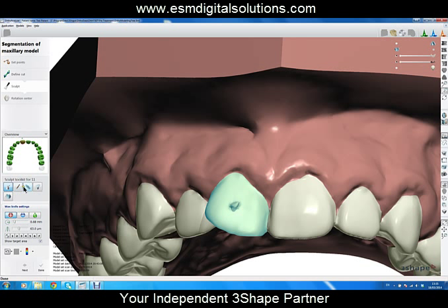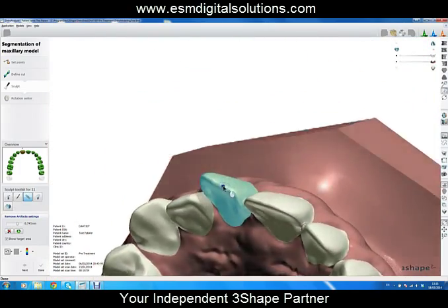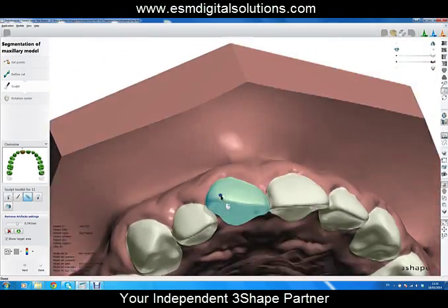If we go to the little icon here that looks like a plaster or a band-aid, we can now just adjust that. We can draw in an area, and when we click apply, the software deletes out everything that's in that area and then fills it in again. So it's a really neat way of deleting any artifacts.